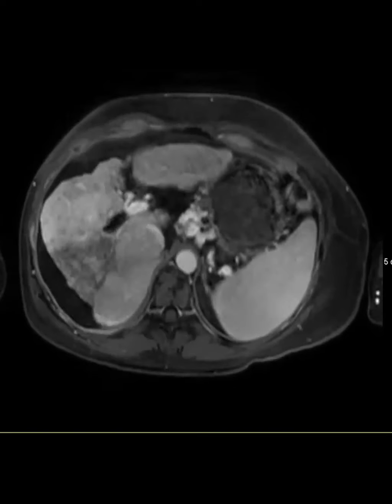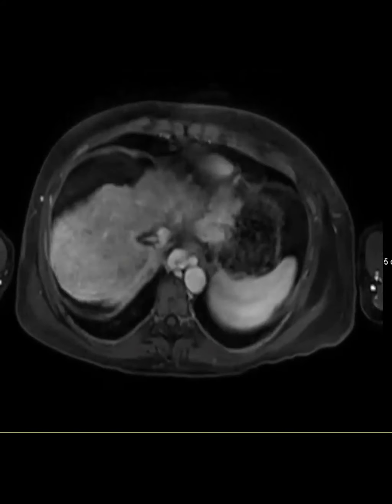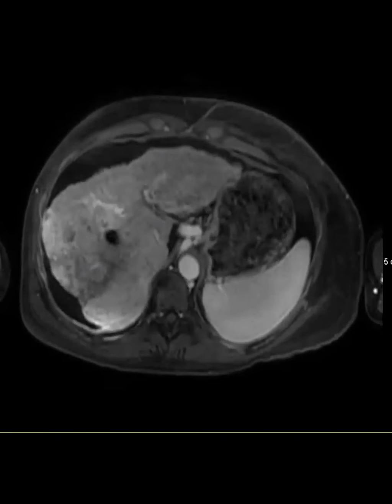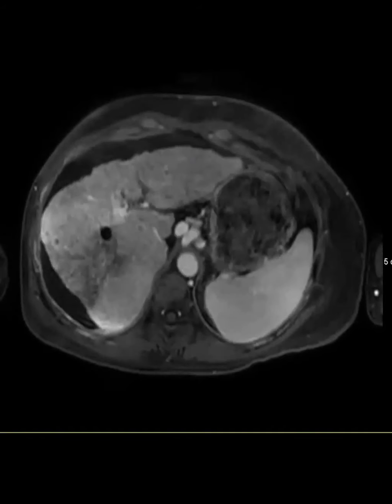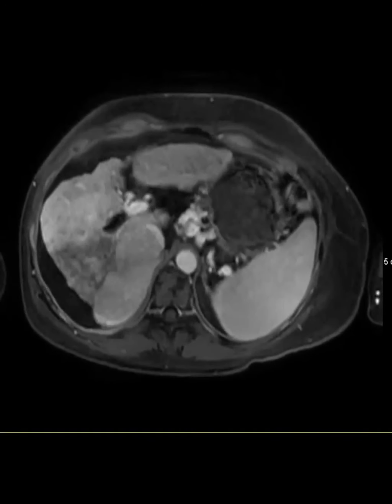Anyway, this is how it was read, and thankfully they decided to sample this patient. They did a transcaval biopsy, where they blindly go into the cava and sample this area, and it came back as infiltrative HCC. This just shows how HCC can be quite sneaky and mean, but this was a very unusual infiltrative HCC case.